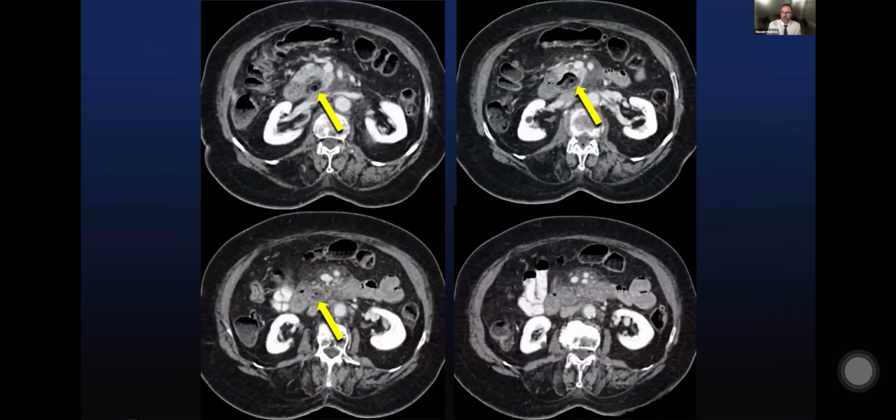Here's another patient with an outpouching of the small bowel. In this case, it's a little bit distal. It doesn't really look like an ulcer, right? We don't see disruption of the mucosal enhancement, but rather there's this sort of boot or sock-like outpouching. It's a classic location for a duodenal diverticulum, and there's surrounding inflammation. This is a case of duodenal diverticulitis. Not very common, but duodenal diverticula are, of course, quite common. And so it makes sense that at times we get complications.